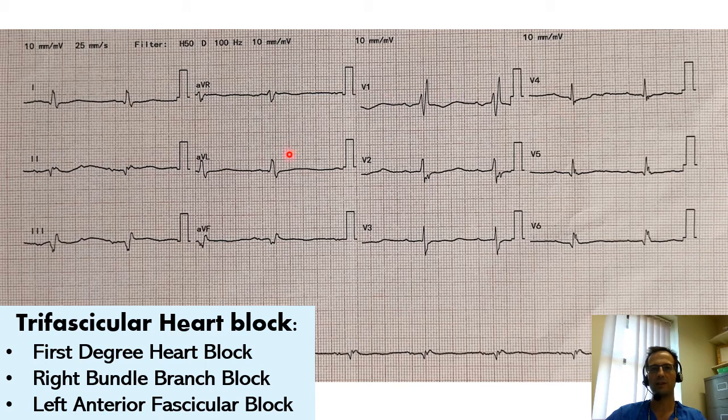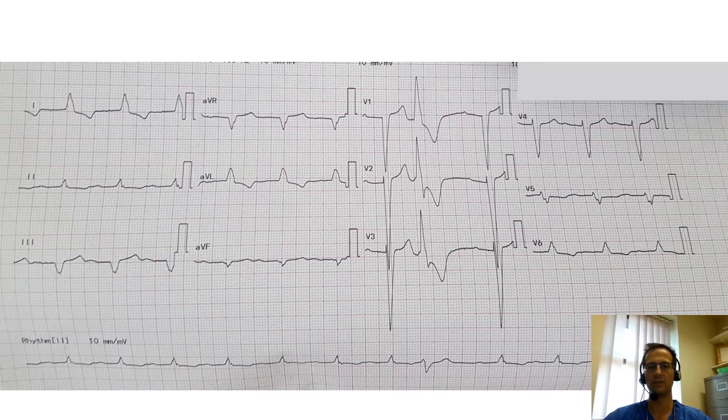So this is trifascicular block, and you would be thinking, even in an asymptomatic patient, about doing a heart monitor to investigate for high degrees of block. But in itself, without any symptoms, without any other high degrees of block seen, it doesn't require any further treatment.